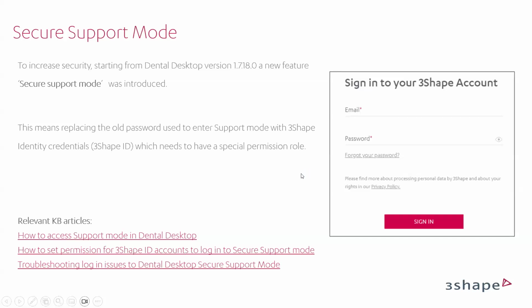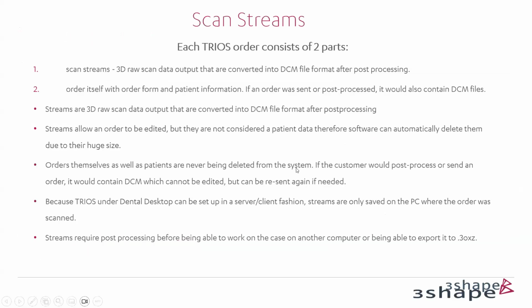So you will just check it. It's something like a tool that helps you check some hidden features of our software as well. Also, as I mentioned, we will check the things called scan streams. Why do we actually use it, and what does it actually mean?